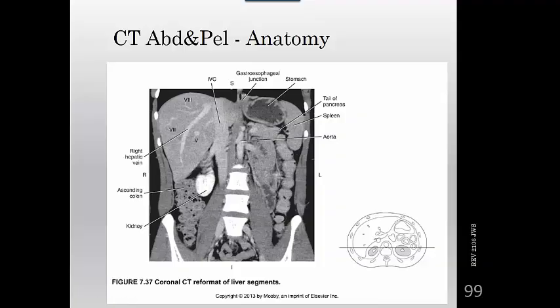Again, there's another slice, coronal slice. This one's going posteriorly through the kidneys, right in behind the aorta, which you see right here, and the spine's coming in. Here's the right kidney, that's a posterior pole that we're catching. Anterior pole of the right kidney, right here, sorry.